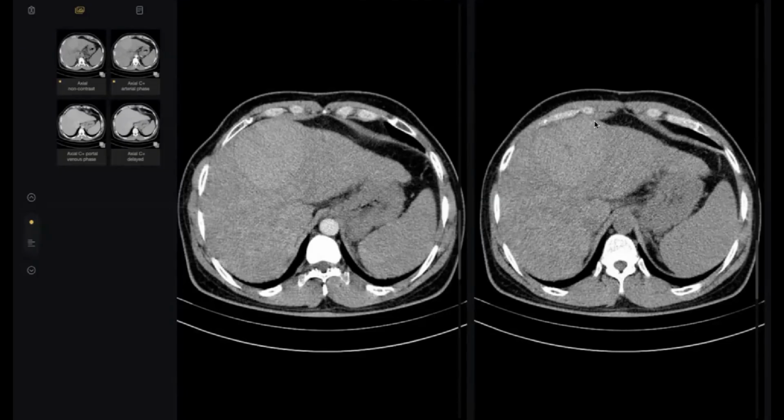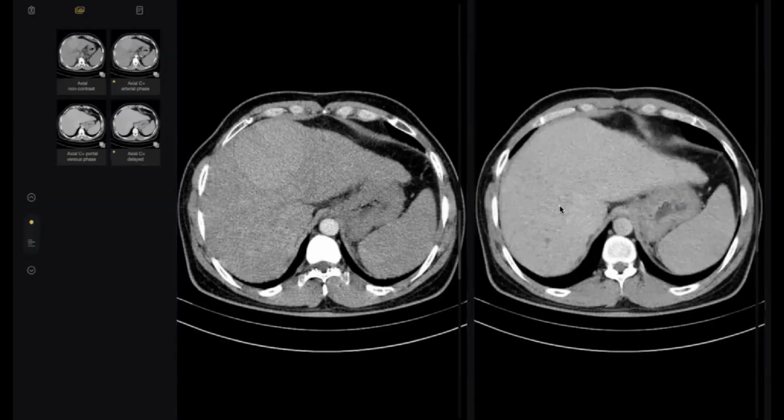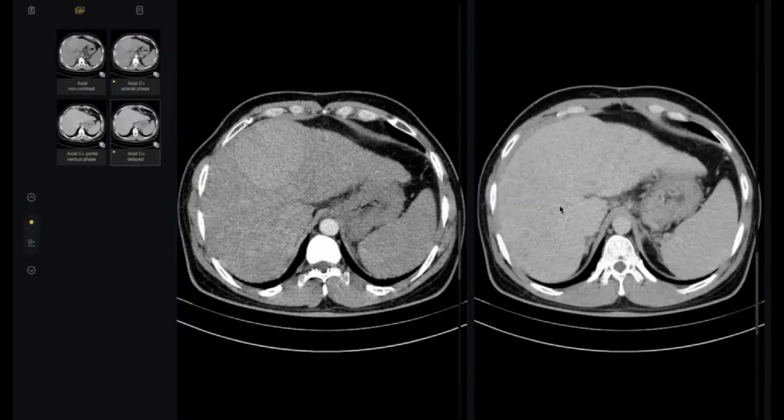By the way, my colleague, LI-RADS is very easy. If you see something like this, hyper on pre-contrast and hyper in the arterial phase, sure, it's benign. He confidently said that this is non-enhancing. So, sir, what's your final diagnosis? It can be an adenoma. It can basically be a LI-RADS 1 or 2 lesion. It is a benign lesion.